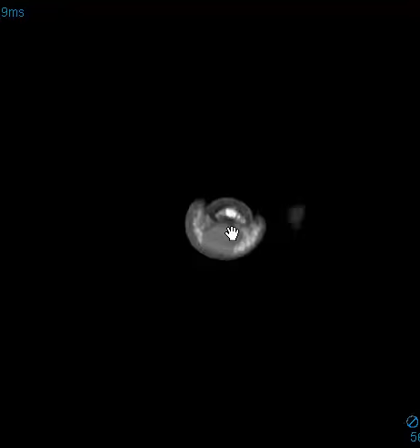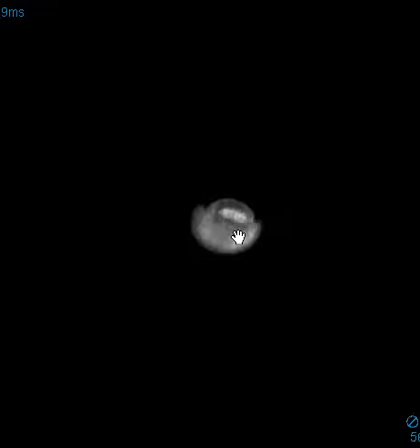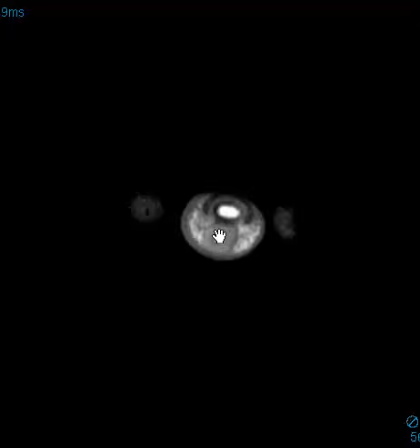The other thing this could be is a giant cell tumor of tendon sheath. They can look just like this. A lot of times they touch the palmar surface, the distal tendon sheath there, and they can look exactly like this. They can be really hyperintense in the T2 sequence just like this as well. So in this case I would mention both.